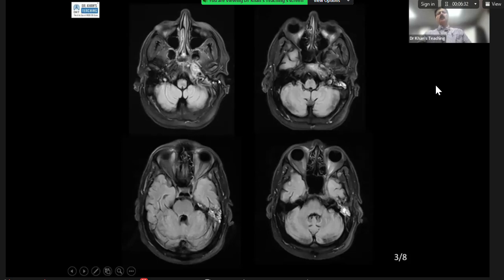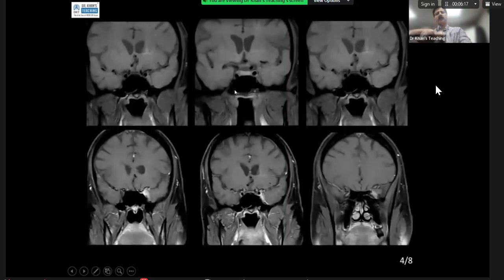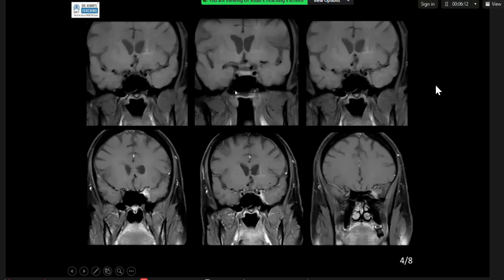This is unusual because we had done a brain type of protocol. The point I'm making is that even on a FLAIR, because it is a fat saturated FLAIR, you can see something happening there. Now, this is post contrast. What's happening? On the left side, we've got high T2 signal, and high T1 post-contrast signal and enhancement at the left side, the anterior middle cranial fossa.